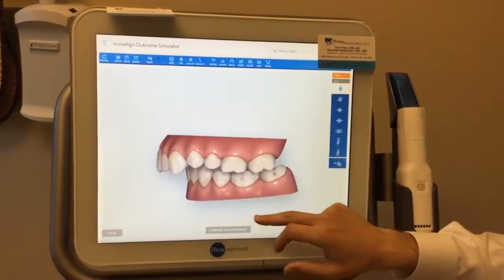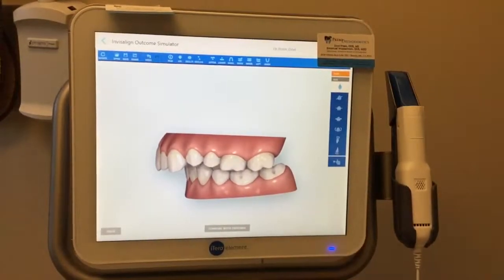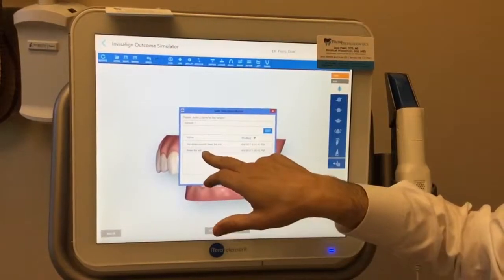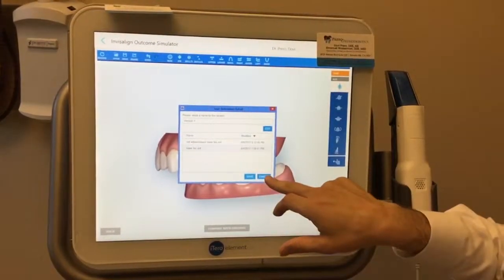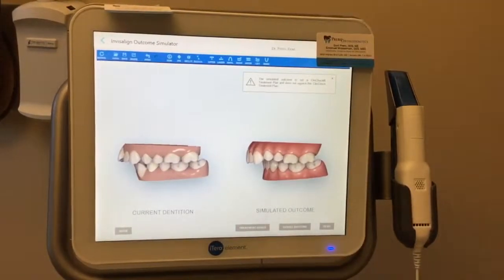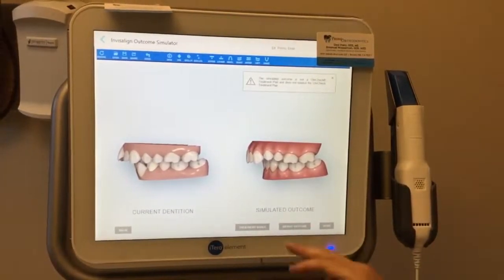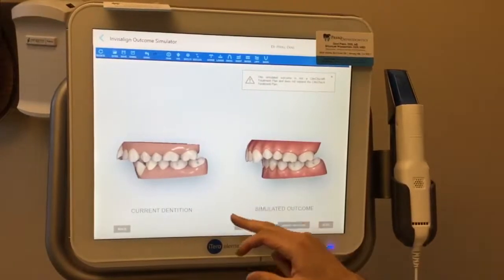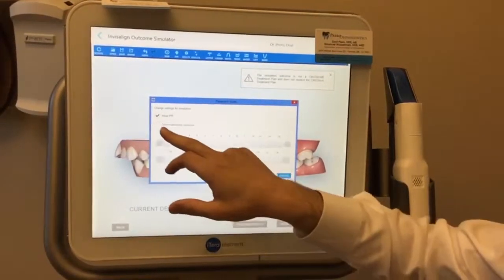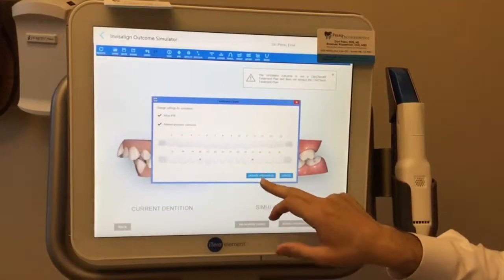And how are we going to show mom how we want to do the lower mandibular advancement? Now, by the way, we can go ahead and save this version here with just the lower bicuspid extraction, so we'll save that for later. Now, let's go back, and how are we going to illustrate to mom that we've now changed our treatment goals to get that full AP correction? Well, we click treatment goals. When we pick treatment goals, we can pick AP correction and then update the simulation.